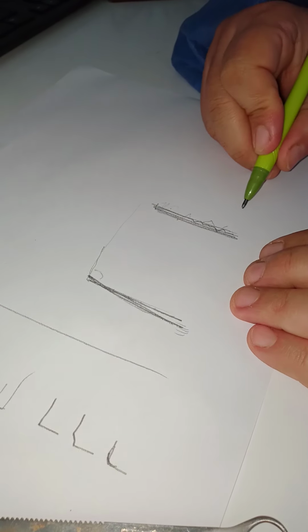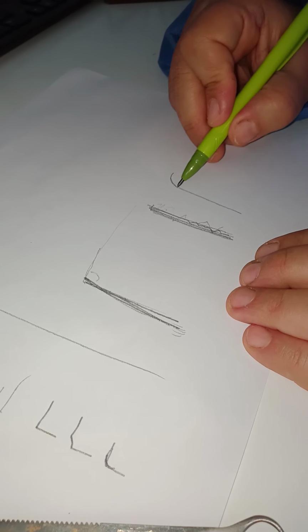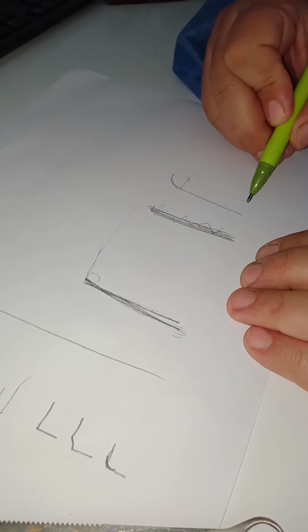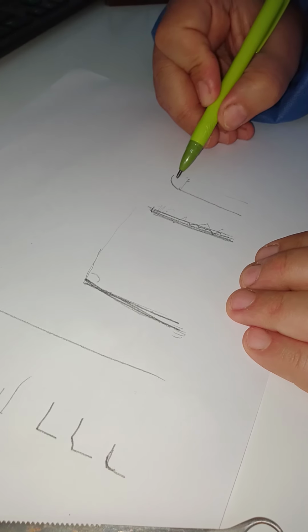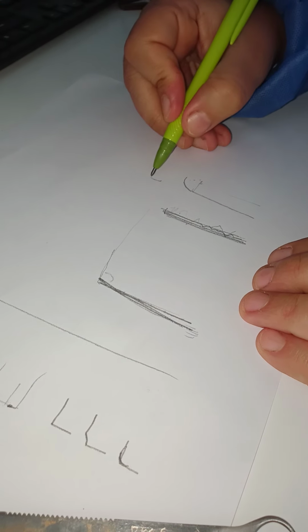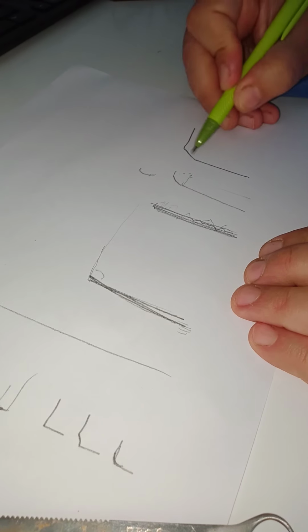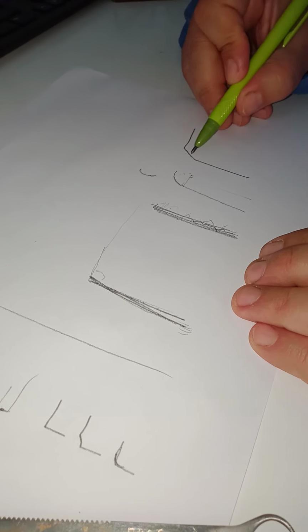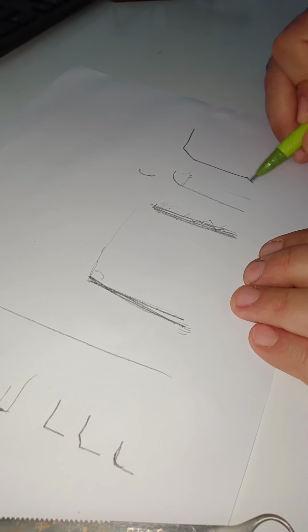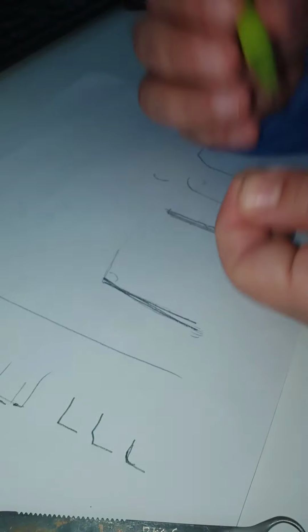If I want to create the round shape, as I said, at the end, the last 0.5 millimeter at the finishing step, because we said we created this as 1 and we want to add a bit to get 1.5. During the finishing step, use the rounded end bur for finishing. If you want this morphology, you come in with the chamfer at the last 0.5 as finishing. Sometimes you need to create a bevel here. Any bur will satisfy. You're going to use the side of the bur.